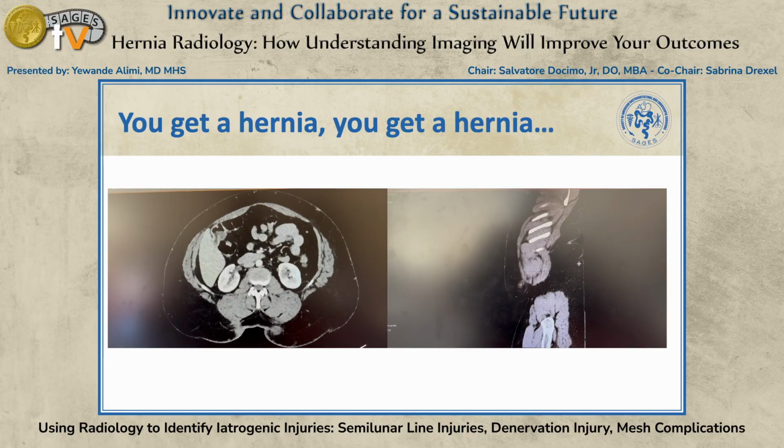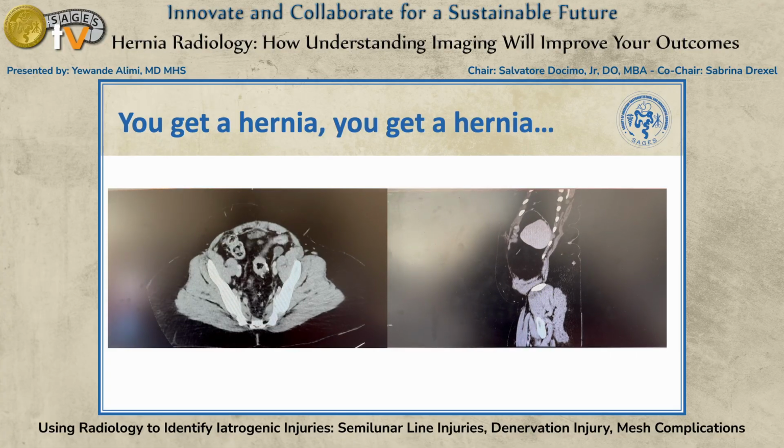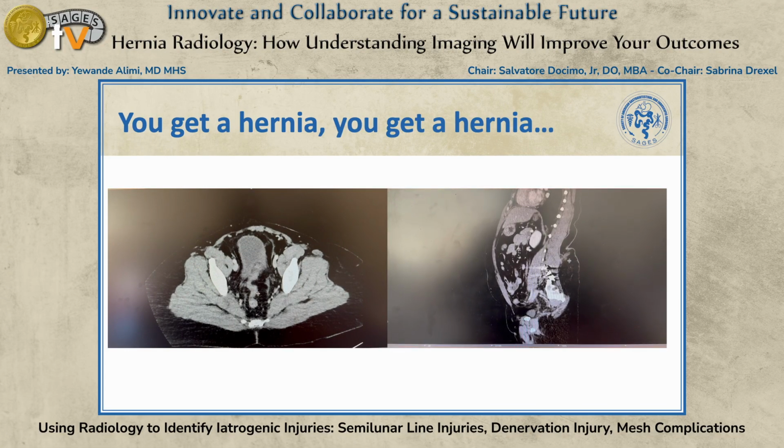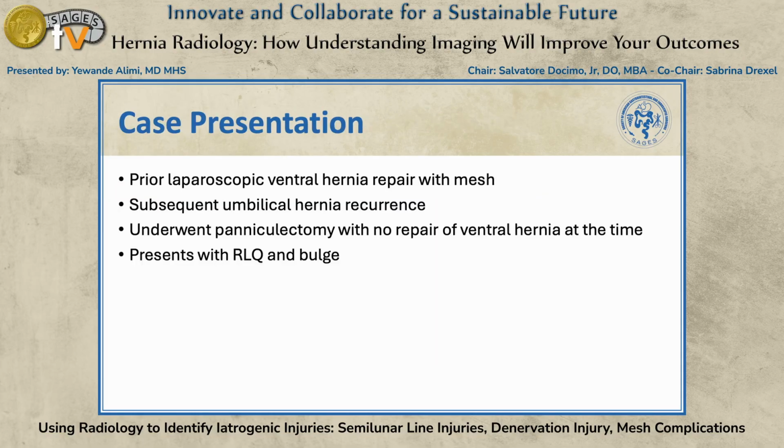But we can see that even though many of us don't close our 8-millimeter ports, or we can poll the audience who is actually closing their 8 millimeters, the patient has developed a hernia in that area. So a hernia begetting another hernia, as you can see there.